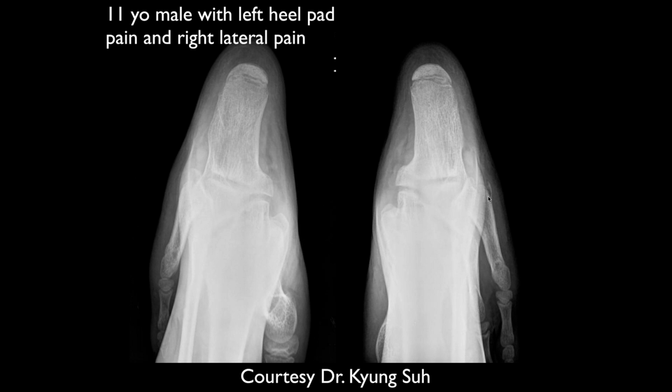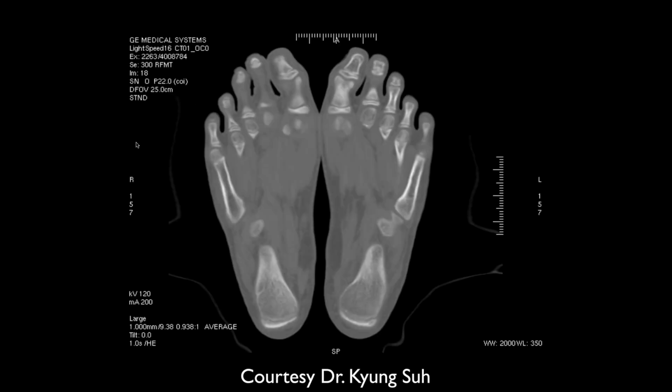I don't know if that's just an apophysis. And for the left heel, there is some irregularity of that calcaneus. There might be a calcaneal fracture.